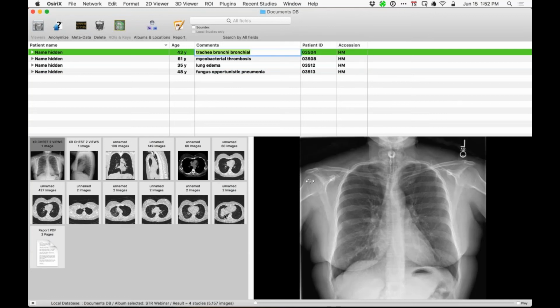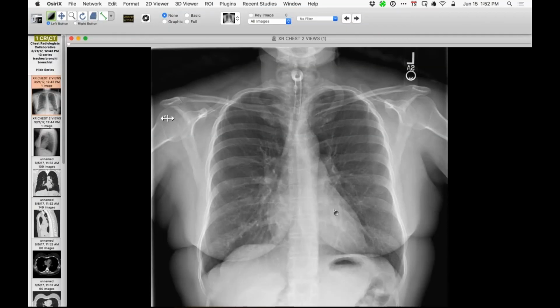Okay. This one is from Leif, so he alerted me to this one. So the only history that I think we had and that he had was this person had tracheostomy for tracheal narrowing. And I'm not sure exactly what diagnosis she carried when she came here, but she's had this tracheostomy for some time for a tracheal stenosis.